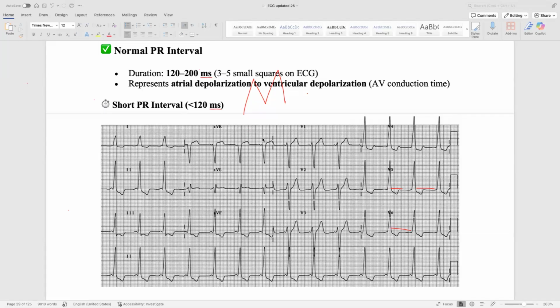We will come to how to differentiate between them very easily and very fast. In V1, V1 is negative. Will you change your mind? Left. That is it. Okay, what is the idea behind that? What is the idea behind the V?